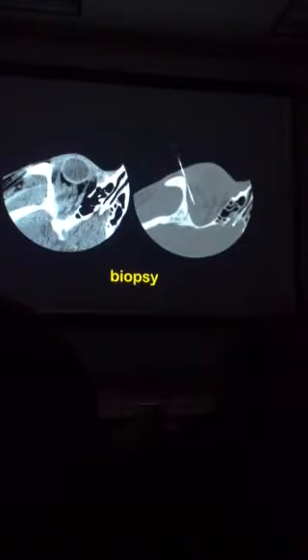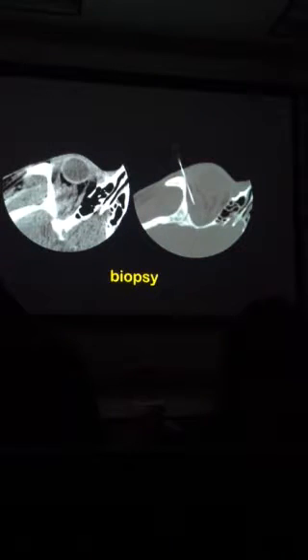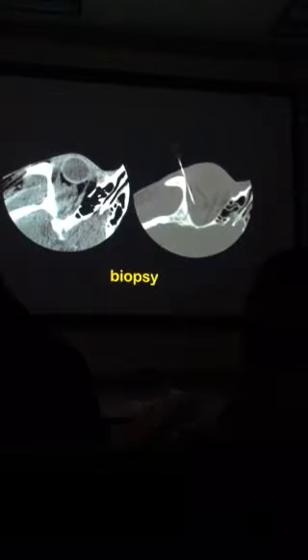yeah? We do biopsies. This is actually not a biopsy, this is a sewing needle. You can see the eye of the needle right there. But this is a mass in the conus right here, and they can do biopsies of that with a little local anesthetic, so the patient does not move their eyes too much.